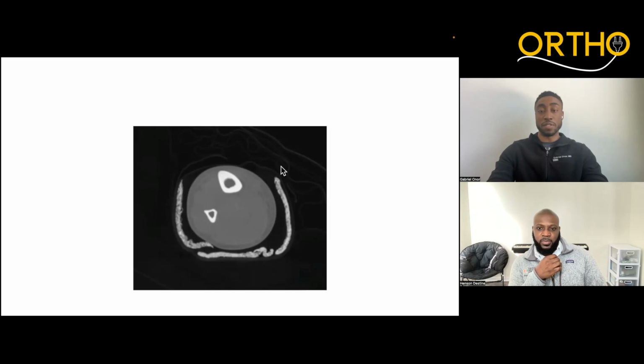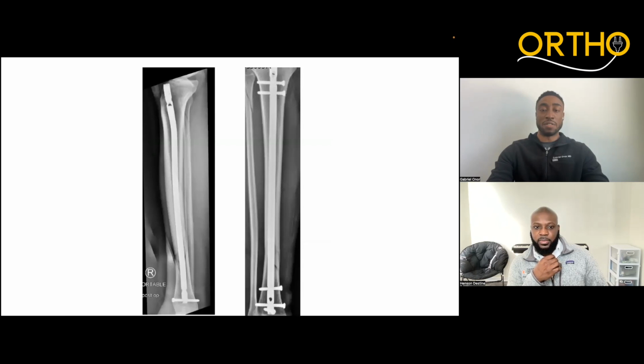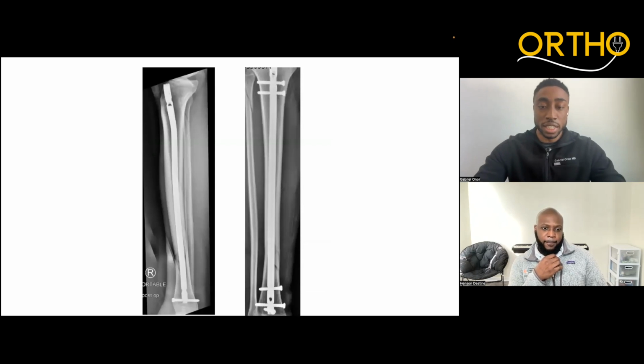Some surgeons, even if they put a screw in the posterior malleolus, wouldn't allow the patient to bear weight for 6 to 8 weeks while that fracture fragment heals. So ultimately, this patient proceeded to the operating room for intramedullary nail fixation of the distal third tibial shaft fracture.